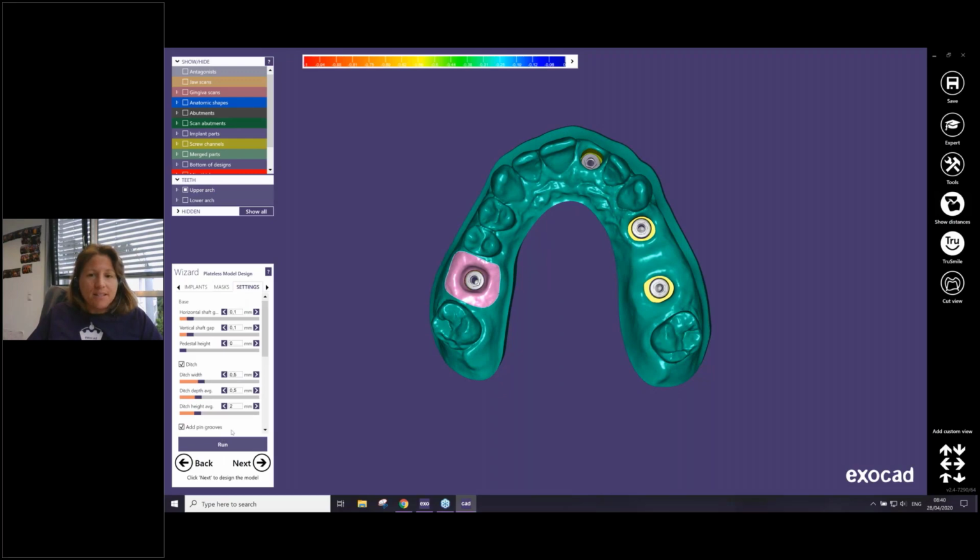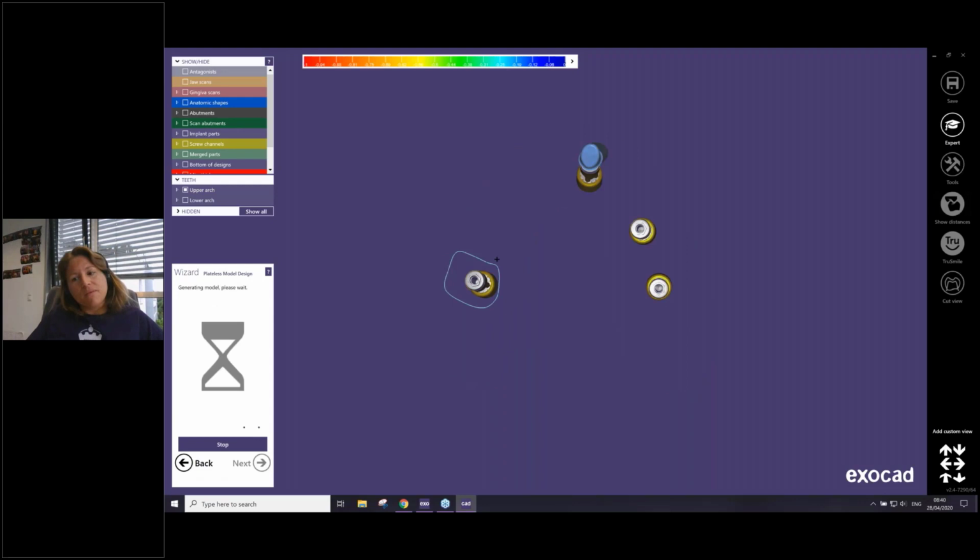Here also, important, sorry. Yes. Question: we have here a lab analog, and sometimes we need to correct the support of the lab analog, the support around the analog, if, for example, the lab analog is too high. And we have a parameter to control this. Please show this setting. Okay, just wait. I have started the calculation to show it. Because I cannot explain this in words.